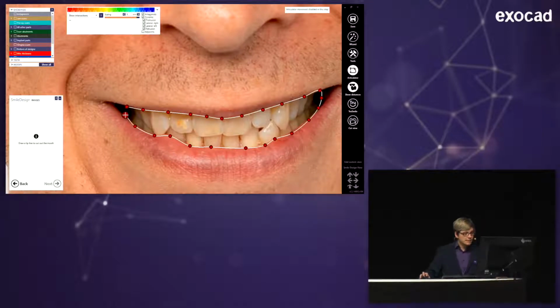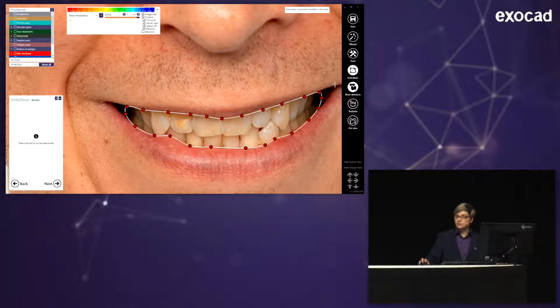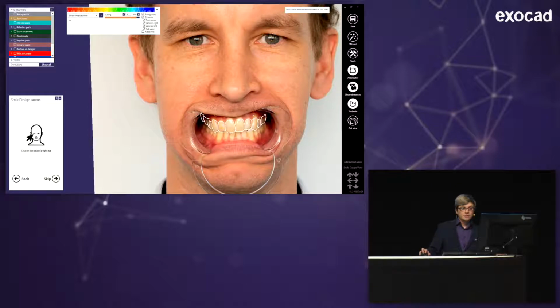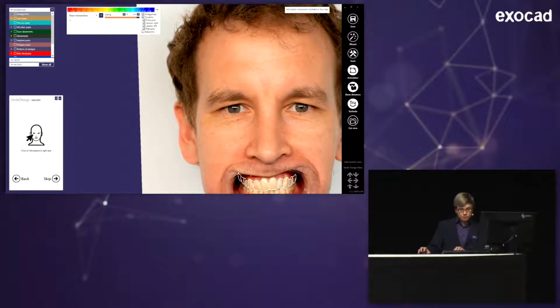And I actually like to leave a bit of dark area here in the corners. I could cut this out as well, but this gives more of a realistic picture in the end. So in the next step, I have to put points on the middle of his eyes. You already see, I'm trying to move this a bit slower.